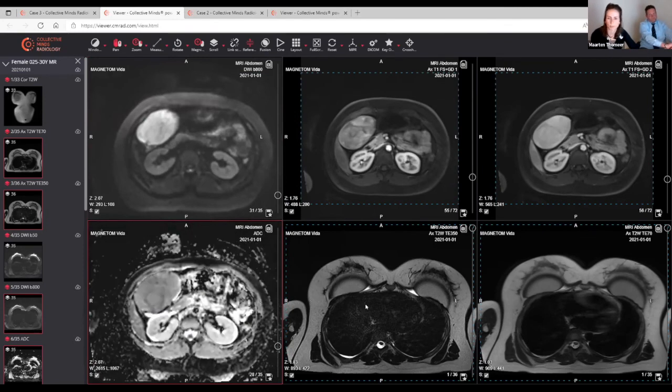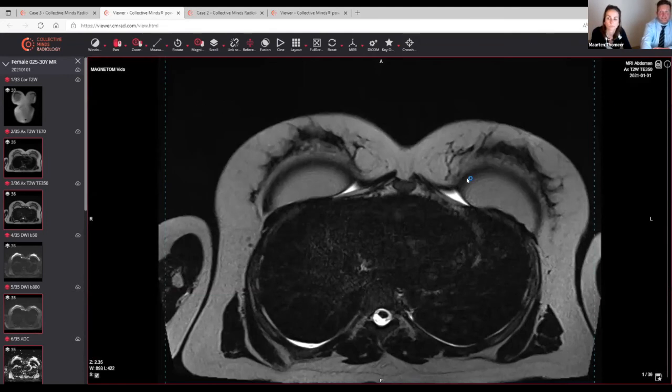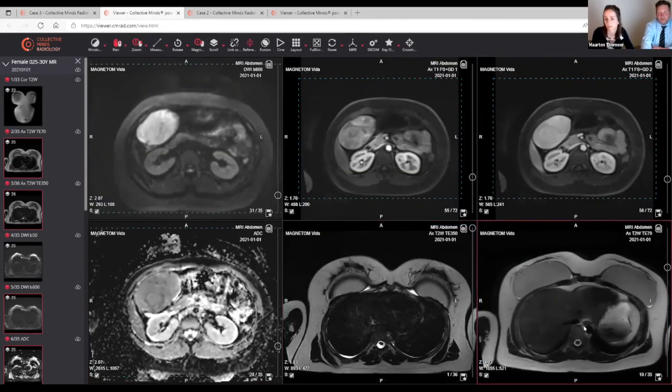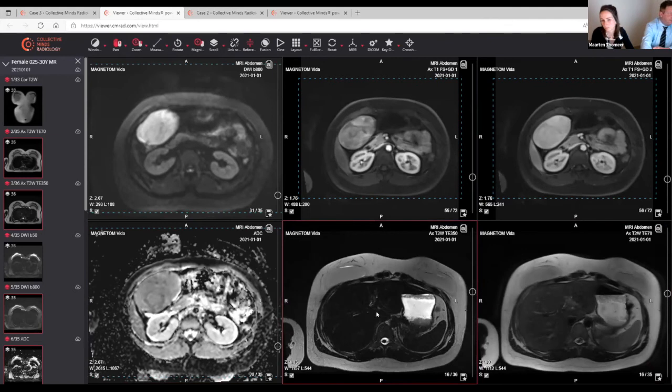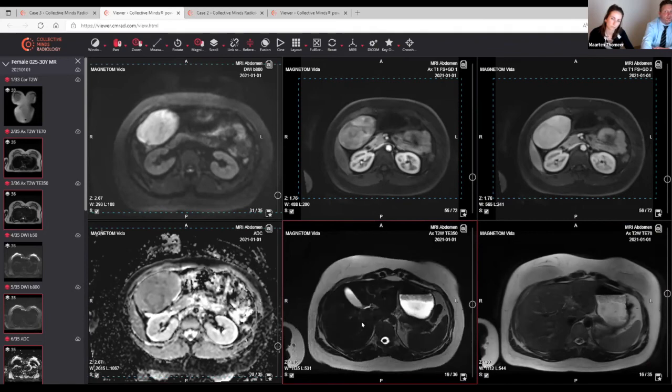If I wanted to look at the T2 weighted images, I noticed that there are two different sequences. Where do we use this T2 weighted sequence for? Well, long ago we always used two echo times for the T2: a long echo time of 350, and the other with 70 to 90 milliseconds. With a longer echo time, there's a dephasing for all tissues except the water. So at the longer echo time of 350, you will see mostly only water signal and fat.